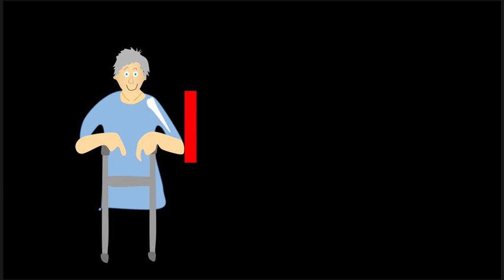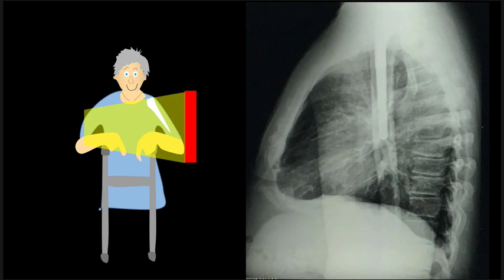So now let's talk about some pitfalls specific to the lateral radiograph. Remember, I mentioned that the ideal scenario is for the patient to have their arms over their head, but because the typical patient population is very sick, it's not always possible. So sometimes the radiograph is performed with the patient's arm down, which can create a big shadow across the lateral radiograph, and we've got some increased density that could potentially confuse you, make you think that there was an airspace opacity there in the lung. It's actually just the increased density secondary to the arm.